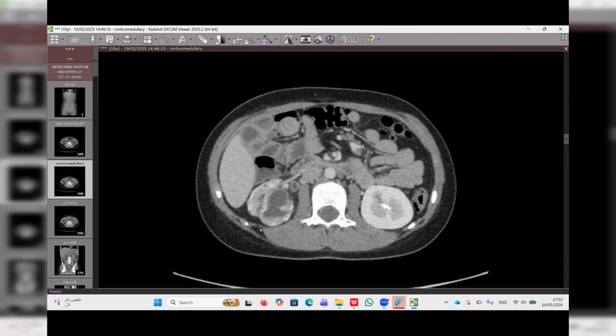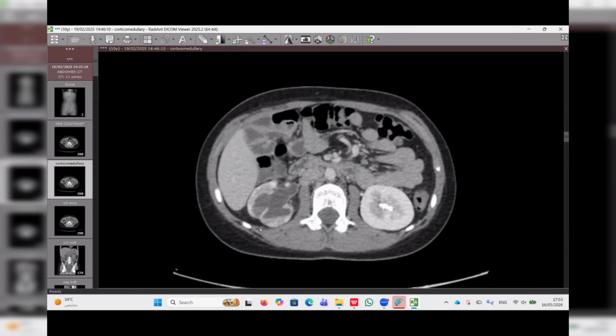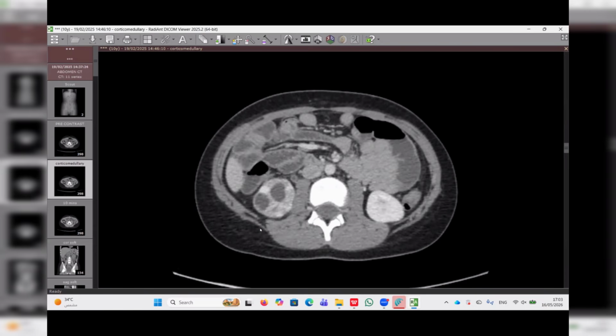Okay. Why do we have recurrent ascending infection? Because I can see that there is ectopic insertion of the ureter and there is dilatation of the ureter, which is likely the cause of recurrent infections. Okay, partially agree. Because we have, can you please scroll down? Yeah. To see the urinary bladder again.